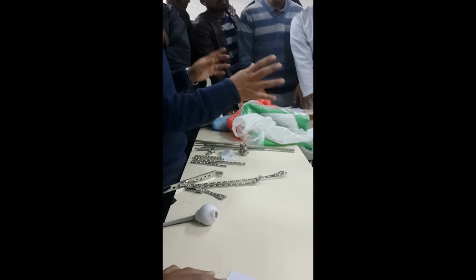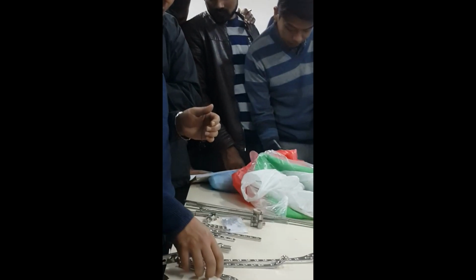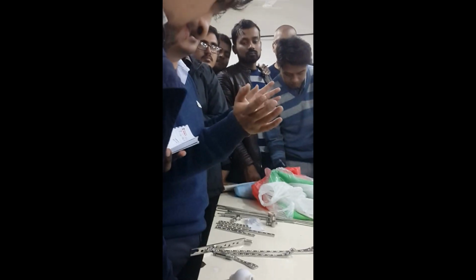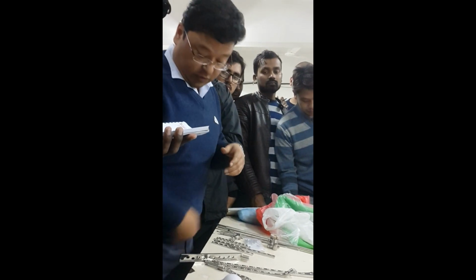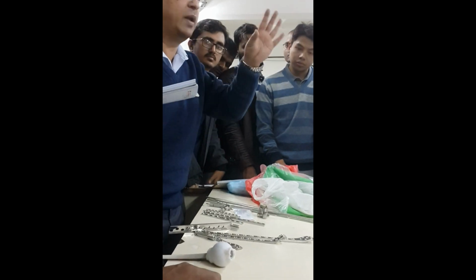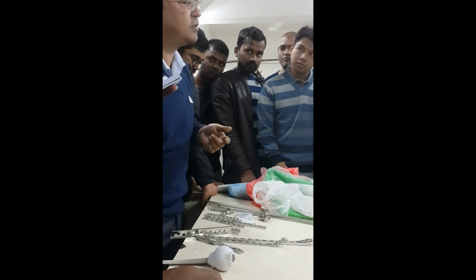Now we come to the locking plates. Locking means it locks in the bone, and the screw also locks in the plate. So it is known as LCP, locking compression plate. And in various places, it is named according to where it is used. All are the family of locking compression plates, LCP. So we can have it in the proximal tibia and tibial plateau where you apply it, the distal tibial locking plate, the distal femur locking plate. But the principle is the same.